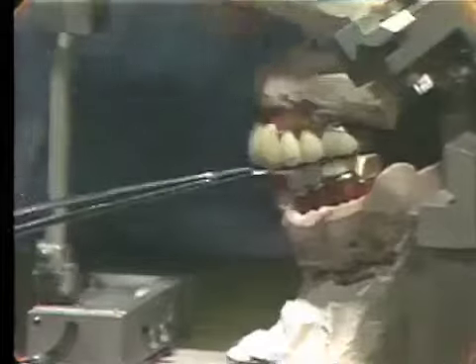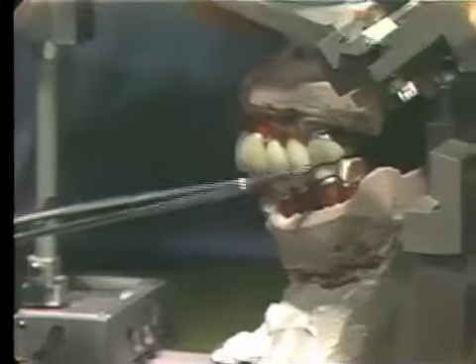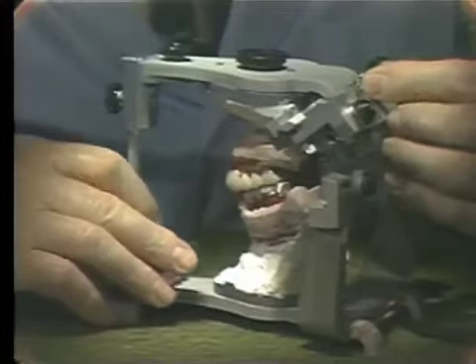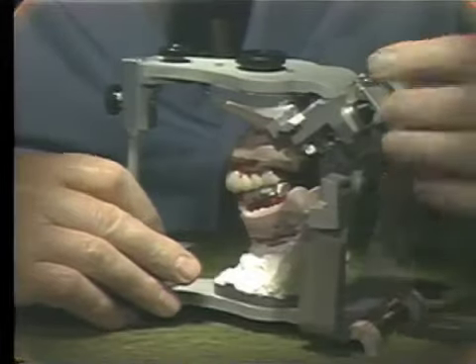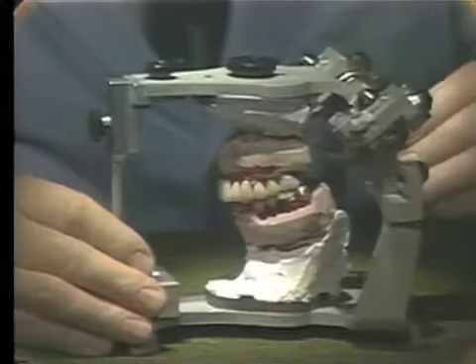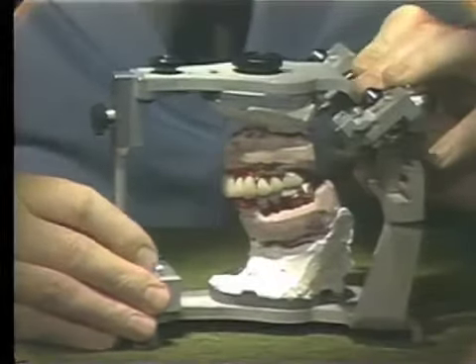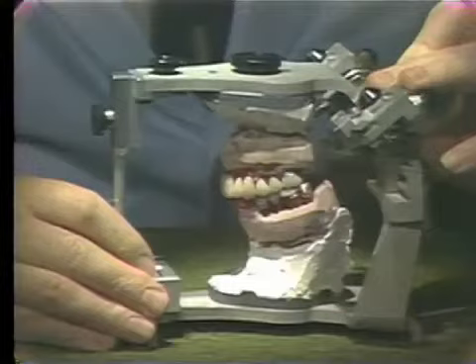Now how far we go with the occlusion at this stage depends on what your plans are going to be. We can go ahead and adjust the occlusion as finely as we can on this mounting because we have done a transfer of our dies, and we can go back to the mouth with a fairly well adjusted occlusion, provided the temporaries have maintained the case. However, if the case has been in the laboratory a long time, this one has been going on 6 months in the laboratory procedures, we could have some change of the teeth, so we are going to plan almost routinely in this case to do a remount of the castings.